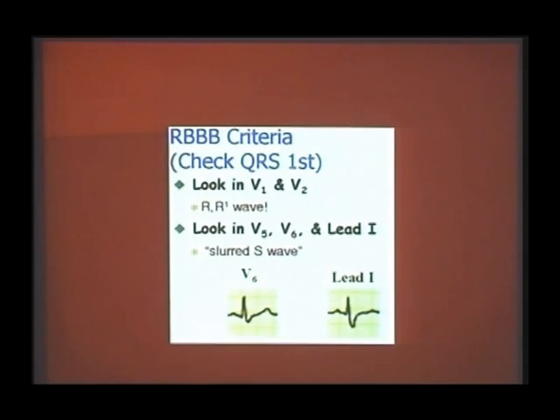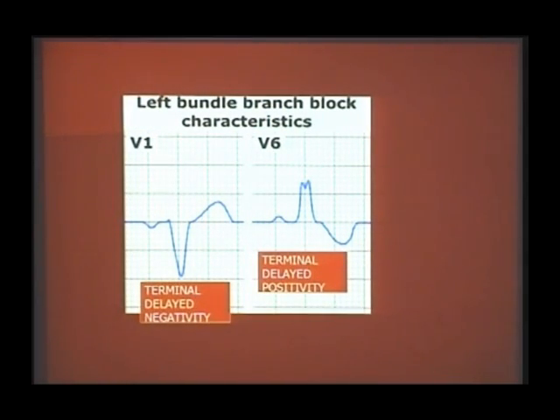So having diagnosed the left bundle branch block, you know it is a disease. Then you have to look for conditions like coronary heart disease, valvular disease, left ventricular hypertrophy, cardiomyopathy, or a conduction system disease. Now, as far as the left bundle branch block is concerned, I told you the criteria to look at the chest leads only.